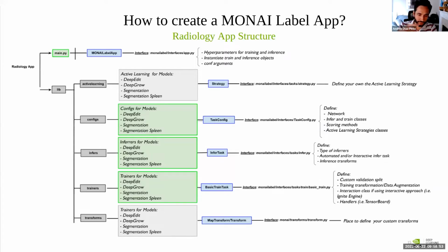If you want to work on the whole image or batch-based images, you define the configuration there. If you don't care about that, you just use the default configuration. The only thing is, of course, you need to define the labels. There is no default. Say I want to work on only liver, you need to change the liver label.